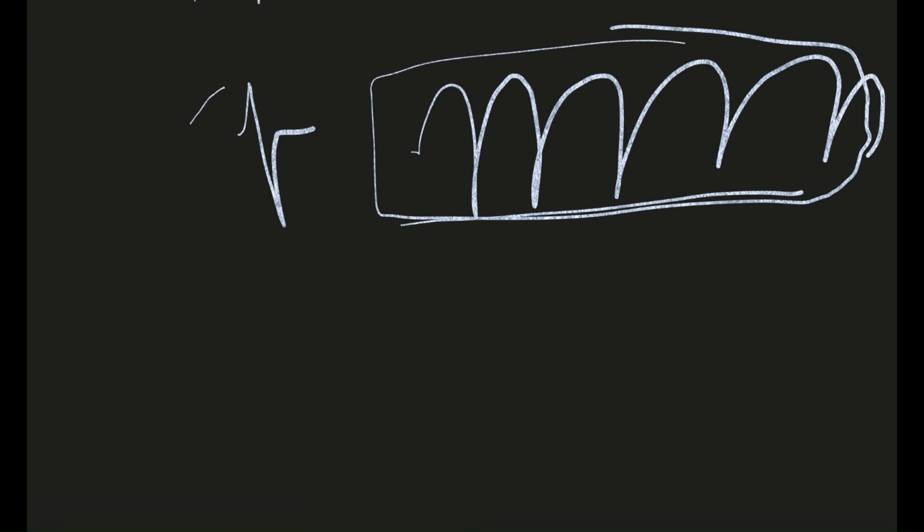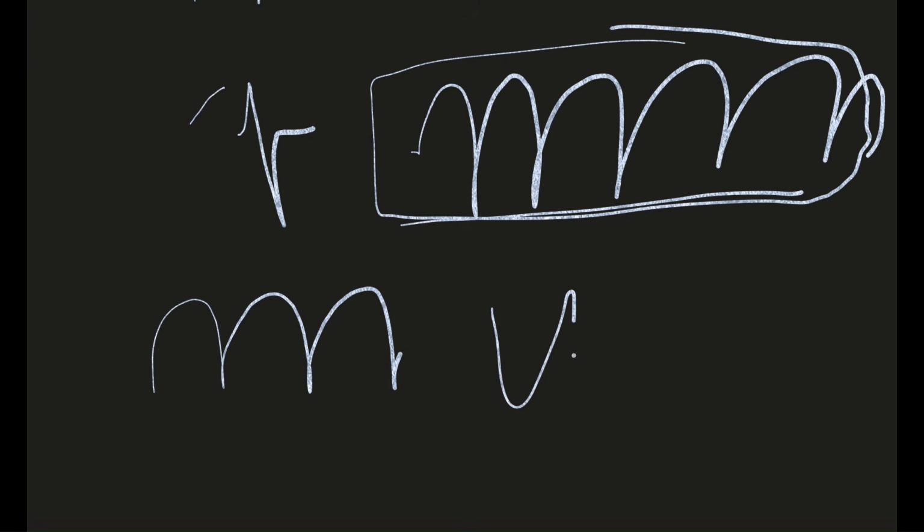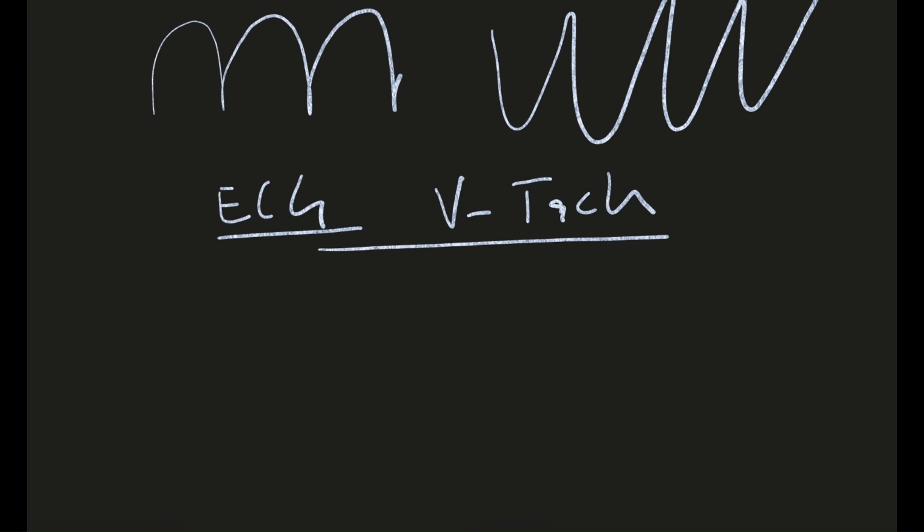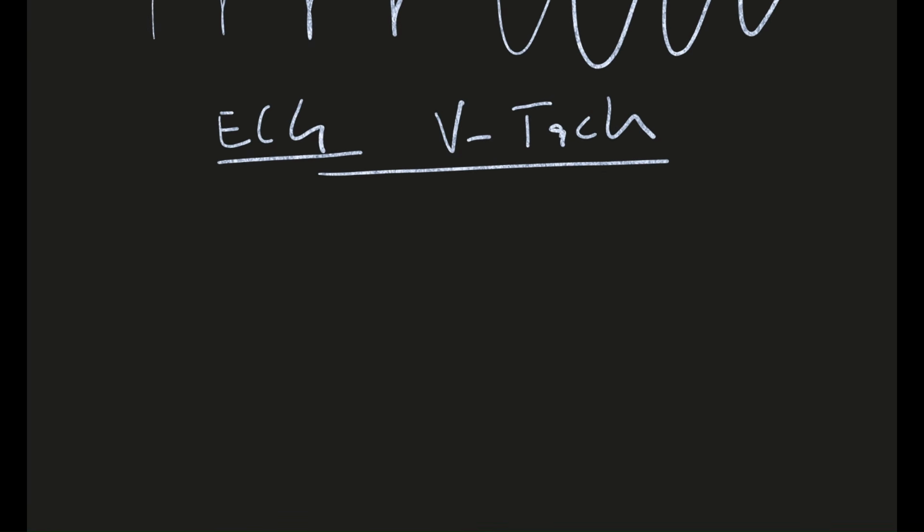However, look, the ECG pattern you will find in ventricular tachycardia will be like this. It could be like this. There will be no proper QRS complex, and P wave is out of question in that. Just search on internet, search in Google, ECG of ventricular tachycardia. You will find a lot more examples over the internet.